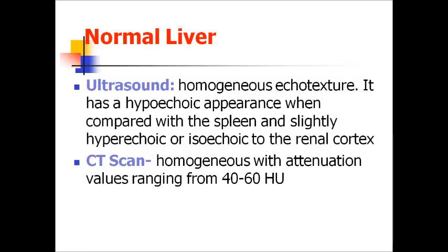Liver, the last organ we will observe. Usual techniques for its examination are ultrasound and CT scan. Signs of normal liver on ultrasound scans are homogeneous echo texture.